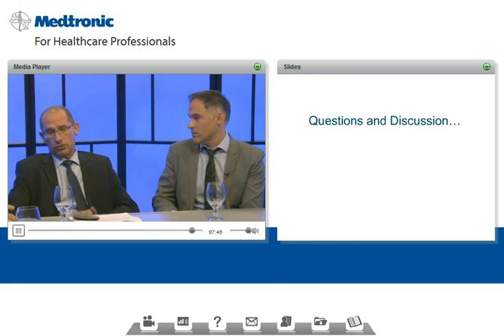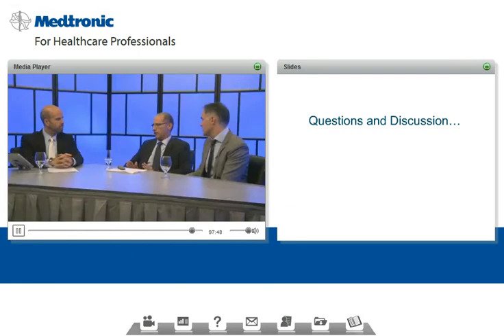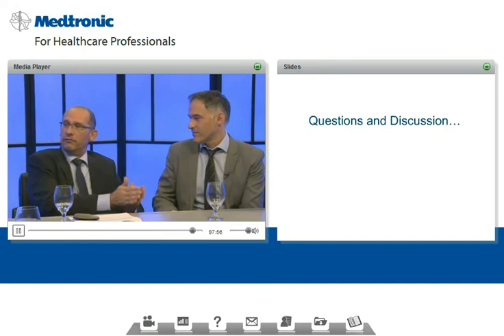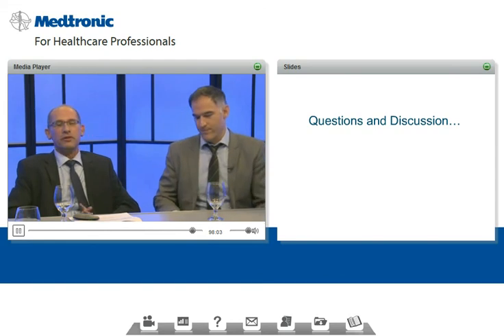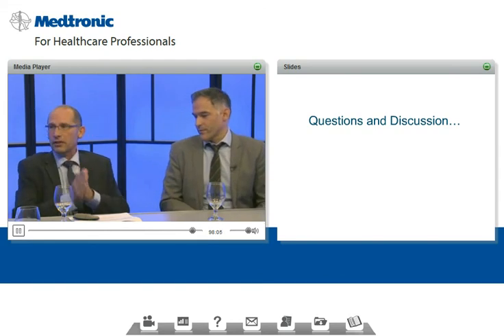I would just add that not everything below 3.9 is the same. You can differentiate between the very, very low, the low, and just on the verge. So you really want to prevent the severe hypoglycemia. This is the main goal.